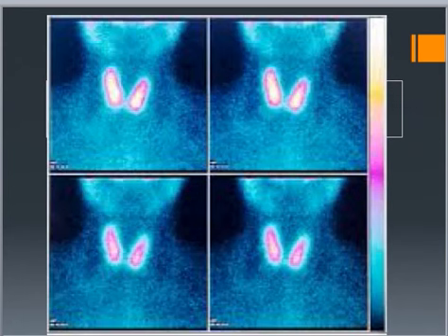This is another type of thyroid scan. So it's color scanned, and usually like red spots would indicate an abnormal growth. So there's varying scales in here, but this is a fairly normal thyroid.